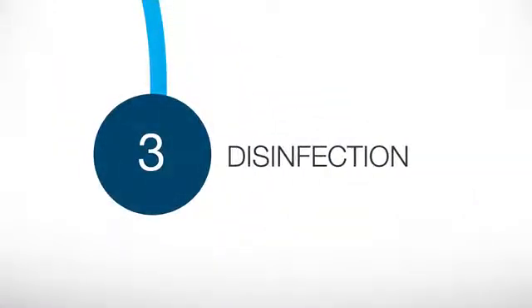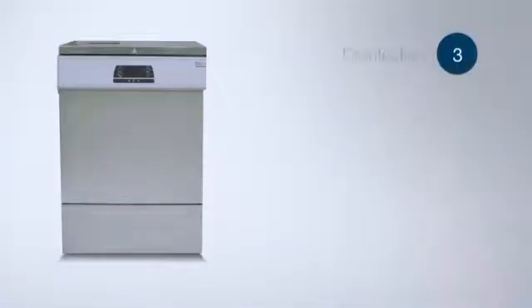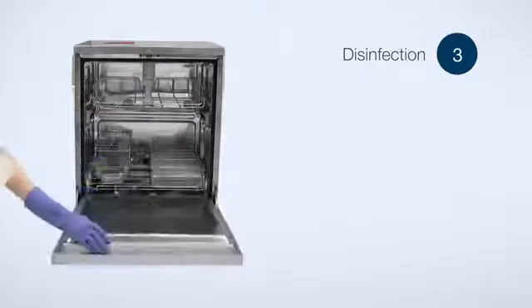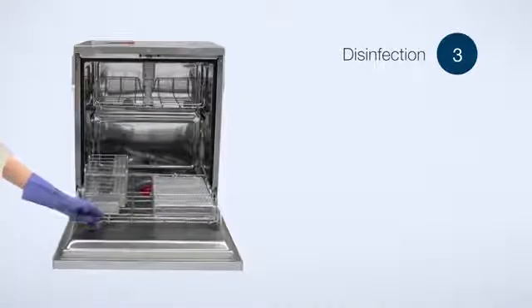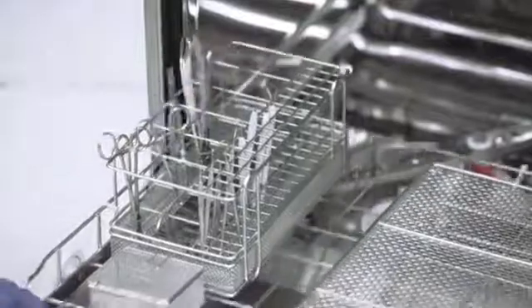This is the first step in partially reducing the bacterial load. If a thermal disinfector is being used, the operator has to insert the instruments into the device and select the correct cycle. Staff need to use a disinfectant if no thermal disinfector is available.